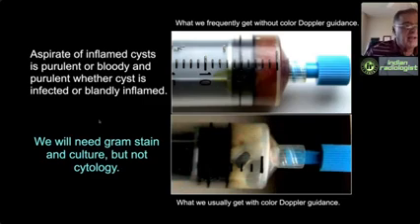Now, what percentage of these inflamed cysts is actually infected? Only a small percentage. Most of this is bland inflammation. What causes the bland inflammation? The lipid contents in the cysts. Lipid is very inflammatory, and again, only a tiny rent or tear in the epithelium can lead to severe inflammation. So the vast majority of these inflamed cysts are not infected.